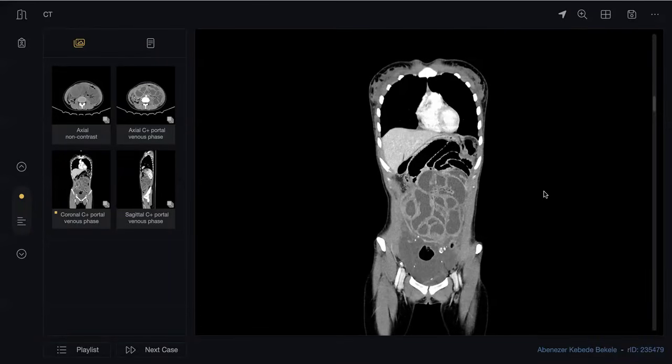In post-tuberculosis cases, the patients are usually complicated secondary to adhesions, or we call it abdominal cocoon formation. Yes, the bowel loops are clumped. They appear like a cocoon. But do you see any capsule here? Yes, I can see these appear to be encapsulated and clumped. Can you show me the capsule? Yes, sure, this one, the whole. This capsule was seen on the axial also.